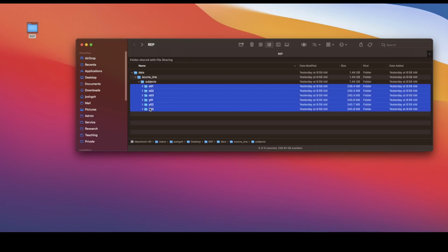You don't have to do this in this way. You can put the subjects data in whatever directory structure that you are comfortable with. This is just a standard practice that we do in our lab. It is closer to what we call the BIDS structure, and I will tell you more about that perhaps in class. That's not really a necessary thing, but this is something that you can try to use.